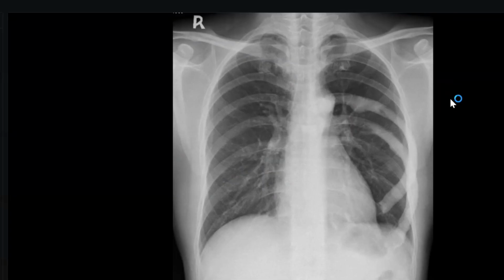Okay. Go on. This patient has a chest radiograph. This is a chest radiograph, frontal projection, of probably a pediatric age group. Are you sure this is a pediatric age group? No, I think this is adult, as the long bones are not okay.